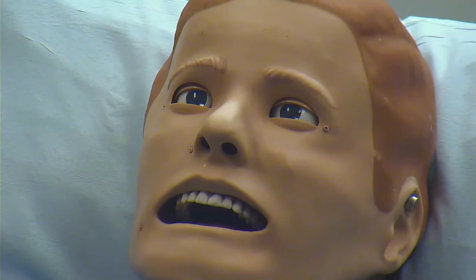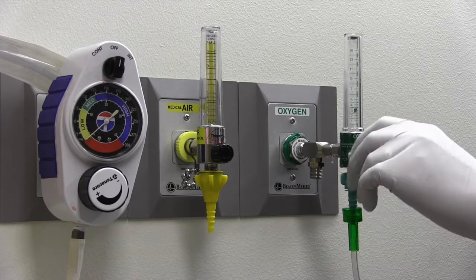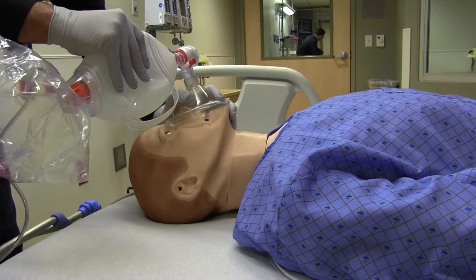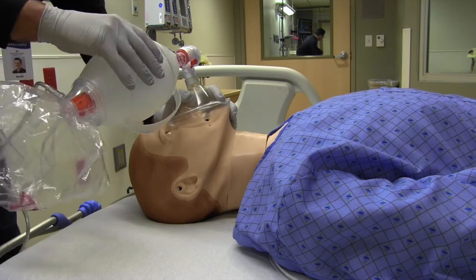When your patient's eyes are wide open and blinking, you can assume that the patient is alert and oriented. The eyes can also be half open, indicating that the patient may be drowsy or sedated, or fully closed, sleeping, or unresponsive. Another function of the Manikin that will help you assess the patient is spontaneous breathing. If you have the question whether your patient is breathing or breathing well, the Manikin does have chest rise and fall. That also includes when applying oxygen with a bag and mask. Respiratory rate will also be shown on the patient monitor.